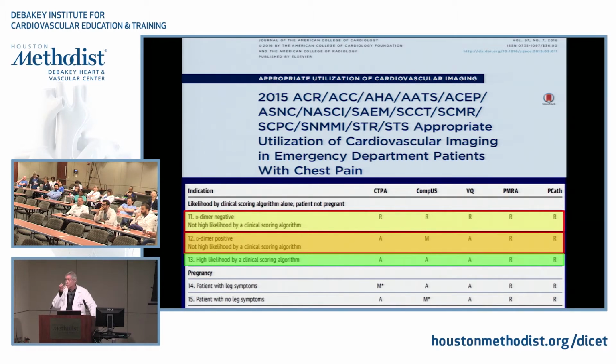The other thing I want to emphasize is that, going down to the subsegmental arteries, there's really no good data to say that those patients necessarily benefit from treatment. So it becomes a little bit of a catch-22 in terms of how much you want to identify or not, right? But certainly for looking at the subsegmental and the secondary and tertiary levels, if you gate these images, you should not miss any pulmonary emboli.